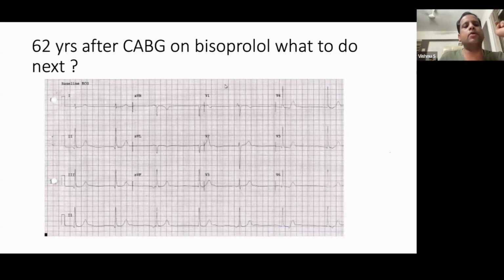If the sinus rhythm picks up and the vagotonia is taken away, then in that case, with this simple test, we can rule out whether this is a conduction system disease or just vagotonia or a beta blocker effect. So this patient was made to walk a little fast and we got a repeat ECG, and his sinus rhythm picked up. So vagotonia is another thing you should bear in mind: this sinus slowing with some junctional beats in an asymptomatic patient.